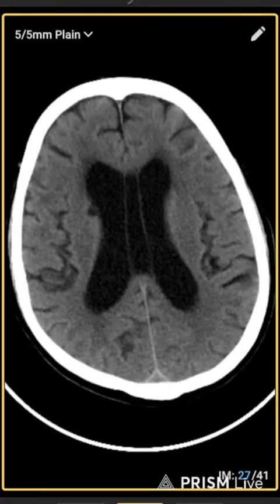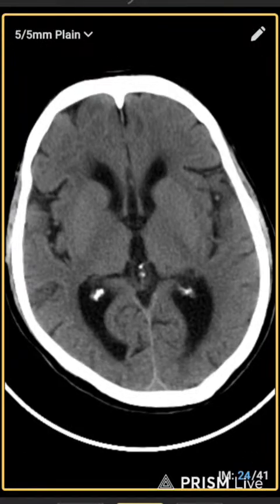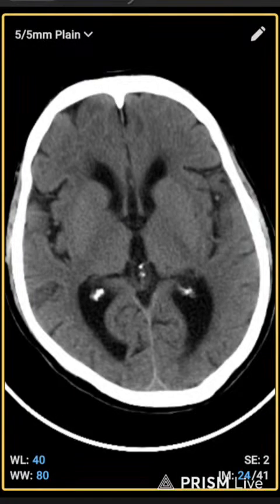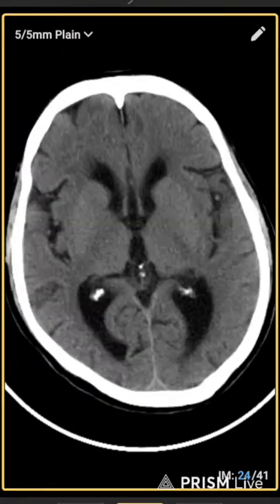If you see this patient, there was a lot of information, but what is the actual problem is this. Here you can see the calcification in this area. This is the calcification, just because calcification is more bright, similar to bone. It will appear sharp bright.